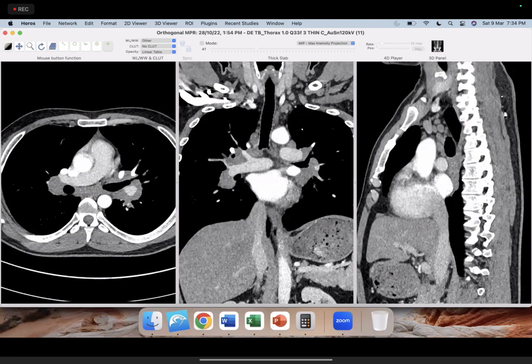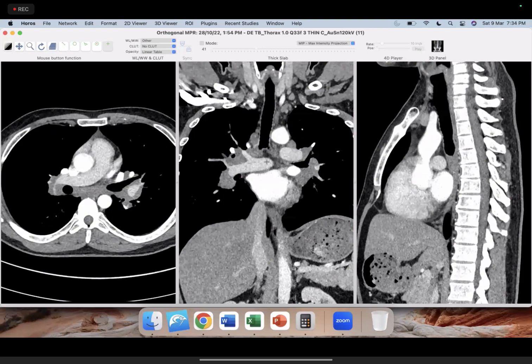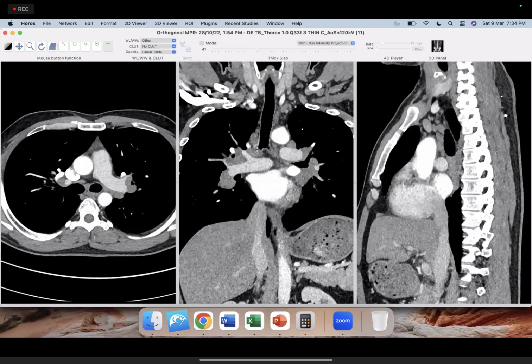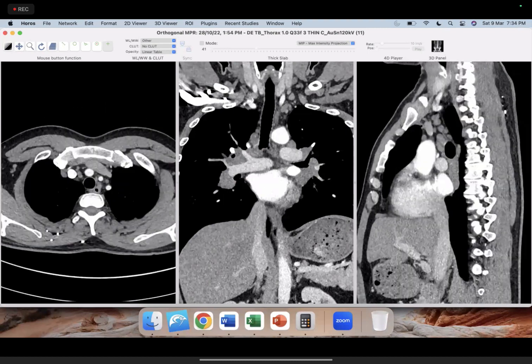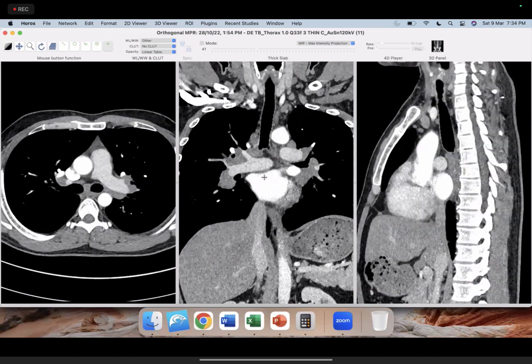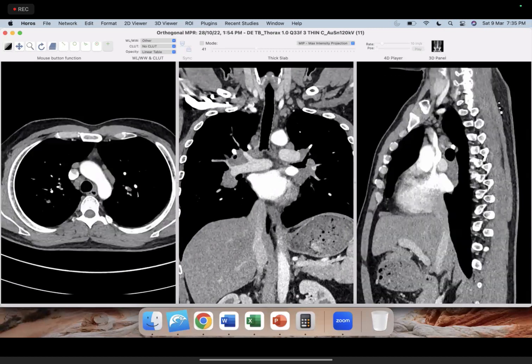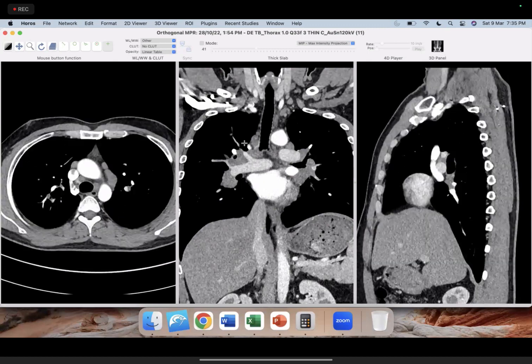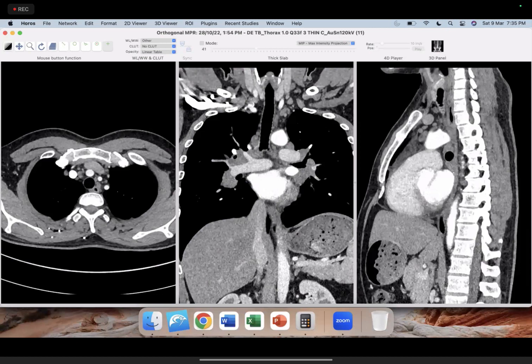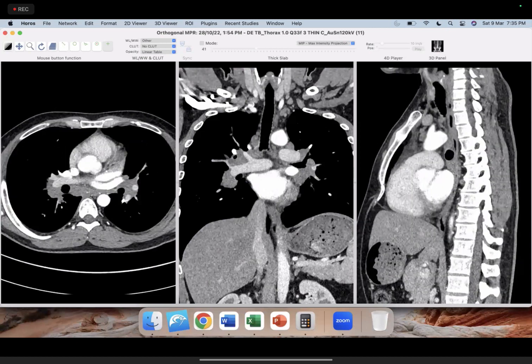The first rule is, no diffuse lung disease should have contrast unless there is an indication. So most of the time you can make your entire interpretation and diagnosis just on the plain scan. But the only time, that is when you see lymph nodes like this, or you have a superimposed complication in the lung, like say a mass or other complication, then only you give contrast. To diagnose or evaluate the interstitial lung disease itself, you don't need contrast. But the moment you see this, you do contrast, and you can see non-necrotic typical mediastinal and bilateral hilar lymph nodes. So this is stage 2 sarcoidosis.